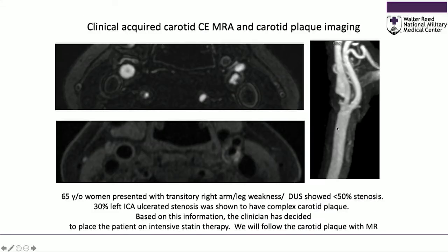And we can recon both of these acquisitions obtained coronally into the axial plane, and we can see there's an ulceration. And yes, I know that stenosis looks tight, but when you use NASCET and you measure it to the distal non-tapering, that was barely 30%, and that was being generous. We know we're worried about this plaque because there's an ulceration, and we can see we have juxtaluminal hemorrhage.